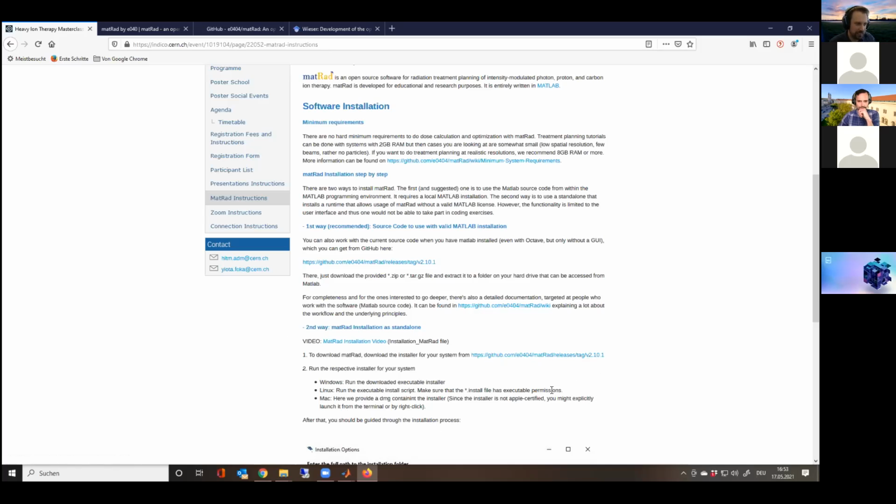I think it wouldn't be too bad to also only work with the masterclass version. Just things will work differently. They will look a little bit different. There will be more buttons, something you might be able to change. So let's say if 75% is allowed with this version, 70% is allowed with the masterclass version. So there are some changes, but if you have this and you don't want to go through the install process again, you should also be able to use this. Okay.